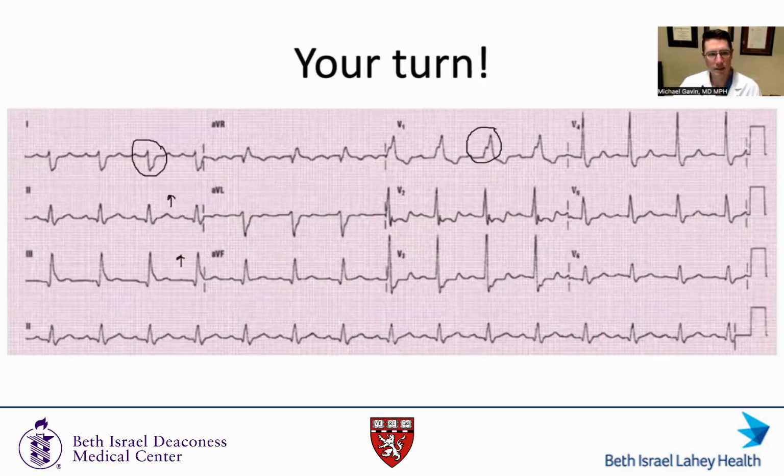And so in this case, you see some other things. Are these septal Q waves, or is this indicative of a prior inferior wall infarct? I'd say I can't rule out an inferior wall infarct. It's wide enough. It's not quite a third, so the ratio of this Q wave to the total QRS complex matters, as does the width, but it's wide enough. So maybe there's an inferior infarct here. But a right bundle branch block with a right axis deviation.